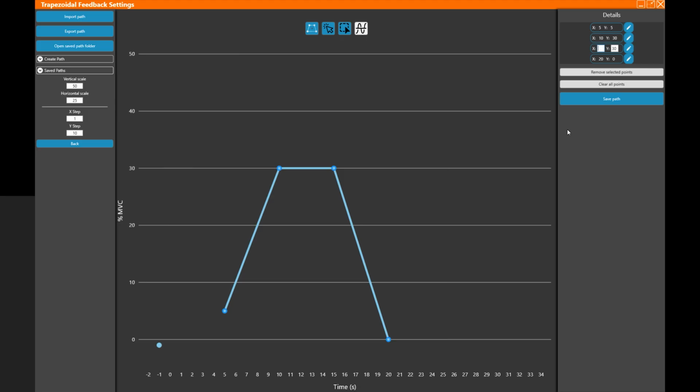Like, for example, like this. You can also swap two points. So, for example, you can click, drag and drop, and you will swap the y value here, and the time value on the x-axis will remain the same. So you're just swapping between the two y values. Okay.